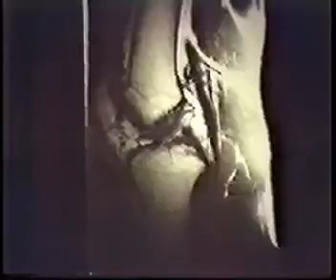Now, the problem occasionally is on a T1 or an intermediate weighted image, the proximal aspect of the anterior cruciate ligament is laterally located, and it really is right next to the lateral femoral condyle, which can sit back in this area, and you can partial volume the medullary fat in the lateral femoral condyle with the proximal aspect of the anterior cruciate, and it can look something like this. It actually looks different, and you can distinguish the two. But the T2 weighted image really helps.